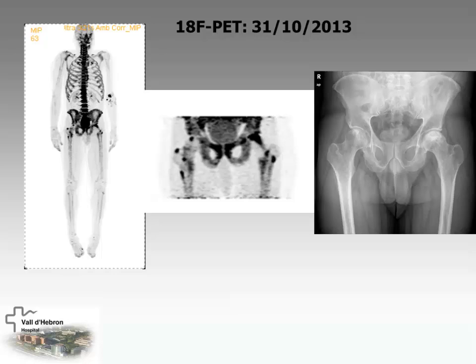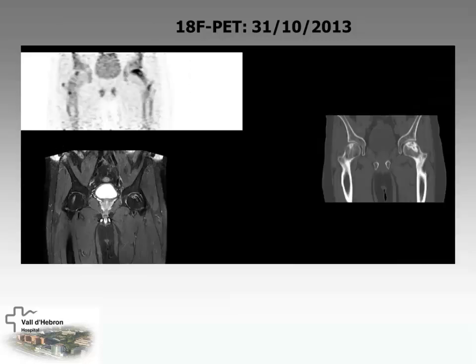Okay, some more images. These are the comparison in this clinical trial. They perform systematically every 3 months, I think, magnetic resonance imaging in order to detect early the bone regeneration. But they fail, and they decide to stop the magnetic resonance image because they detect only bone abnormalities, but not early regeneration like the PET scan does.